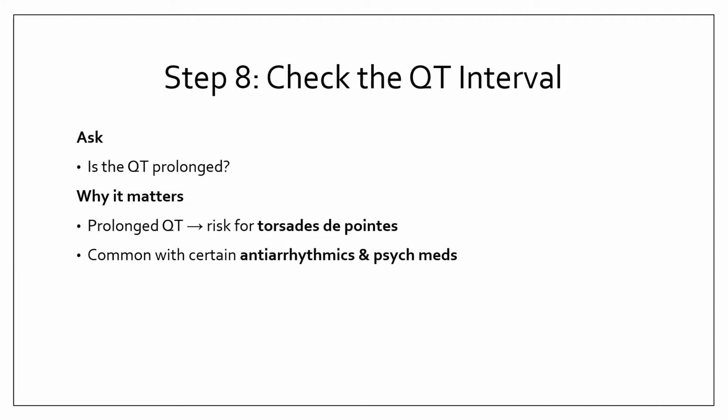The QT interval represents the total time for ventricular depolarization and repolarization, and it's measured from the beginning of the QRS complex to the end of the T wave. The QT interval varies with heart rate, so we care about whether it is appropriately short or abnormally prolonged.